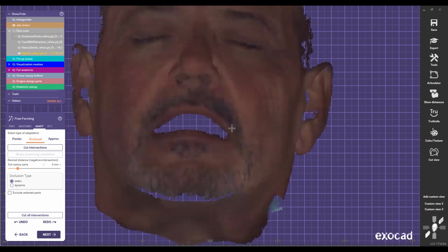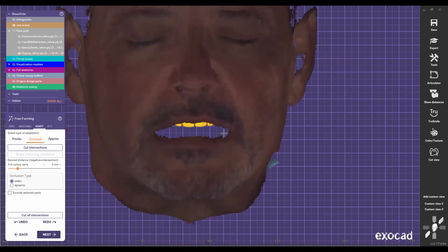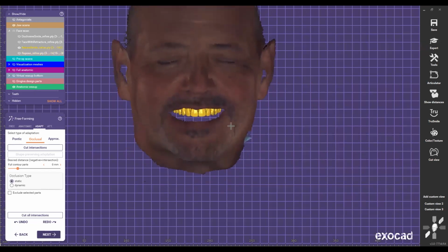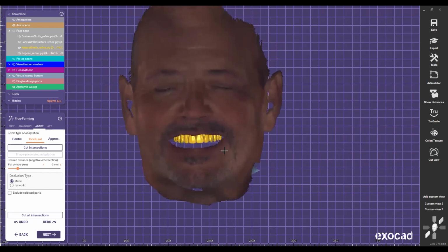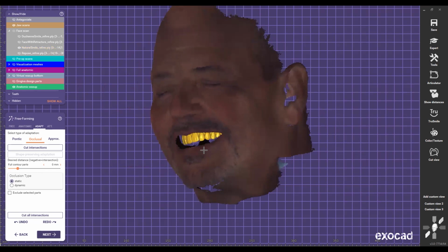So I can see the repose, right? I can see that it's going to be just right there. Beautiful, and a natural smile. There are no curves, no canted smile, no midline off. You can see right away. If it looks good in the face here, I can close my eyes and I don't even have to see the delivery, because I know it's going to look exactly the same as here.